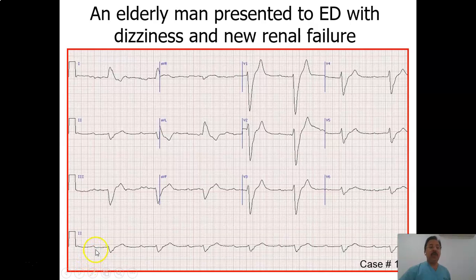So rhythm, if you see here, this is a P wave with a long PR interval, then QRS complex, P wave with the long PR interval, and P wave with the long PR interval throughout. This looks like the ECG is stretched. So the PR interval is prolonged. So this is first degree AV block.